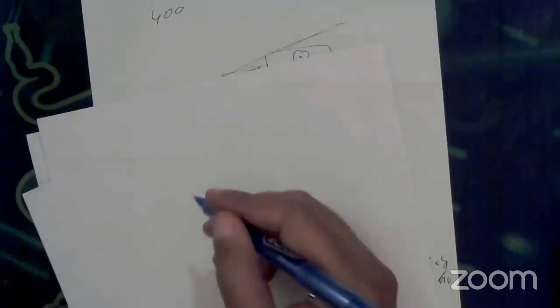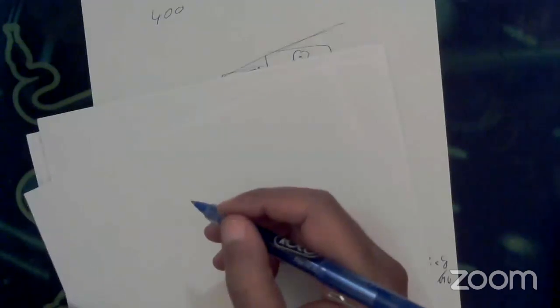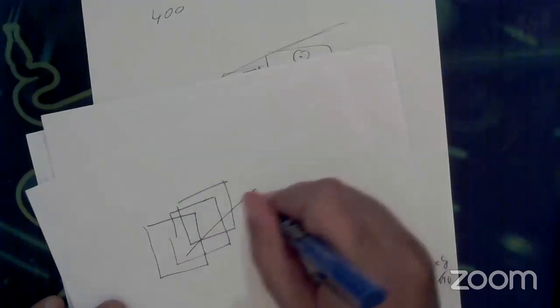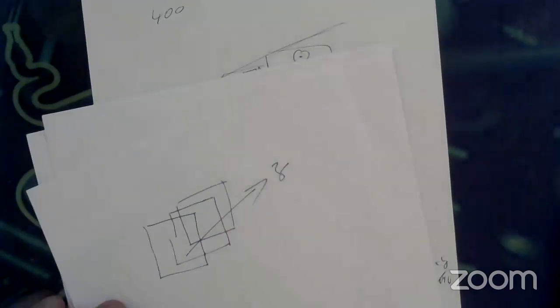So for example, I'm going to talk about, let's say, Eclipse. I know about Eclipse. In Eclipse, we have the slices like this, okay? And then this is the third slice, okay, like that. This is actually the Z-axis in Eclipse.